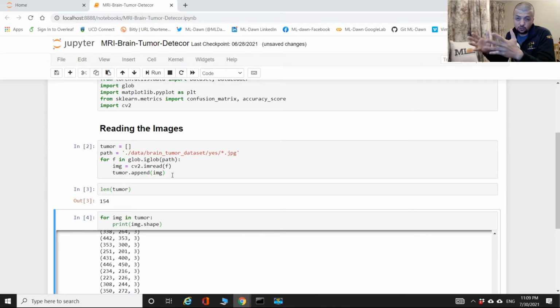And why this matters, first of all, you want to make the size of your input data consistent, because you're going to use this with a machine learning algorithm, in particular a neural network in our project. So you have to fix the length and the dimension of your images, or of your data. That's how you deal with neural networks in particular. The dimensionality of the data has to be fixed. It shouldn't be the case that your x1 has a certain dimension and the x2, which is your second input data, has a totally different dimensionality. All of a sudden you have 3 channels and then 1 channel and then 10 channels. That's not how it works. So you have to make sure that you are consistent dimension-wise across your images.